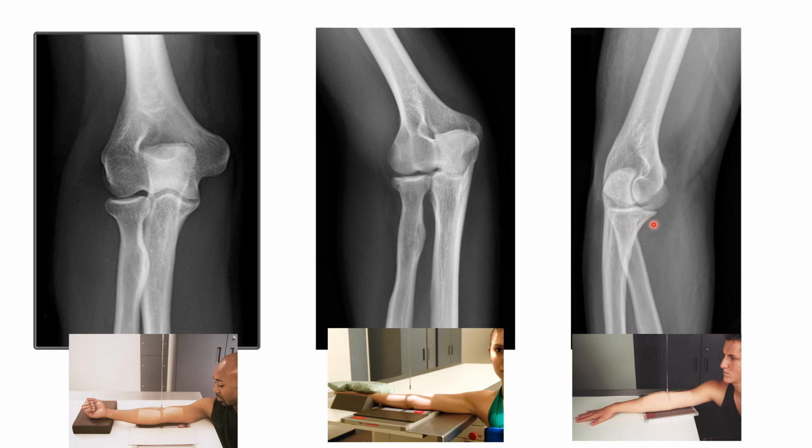So what we're looking at here is that, if you look at his arm, you can follow it from his axilla region here, his armpit, down the arm. You can see it's the medial side of the arm that's making contact with the IR now, and the lateral side of his elbow is up away from the IR. So that tells us that the structures of interest in this image will be the more medial structures.